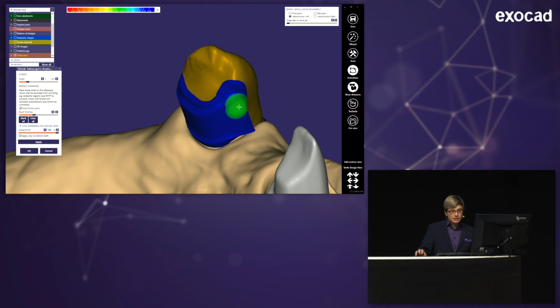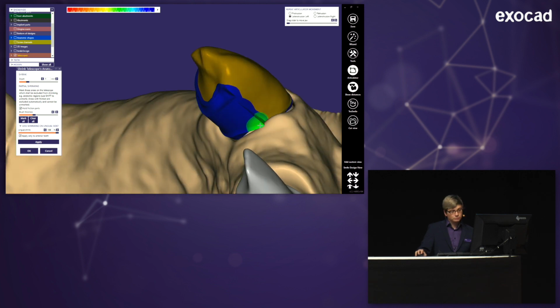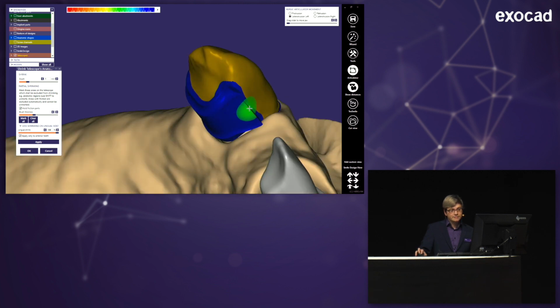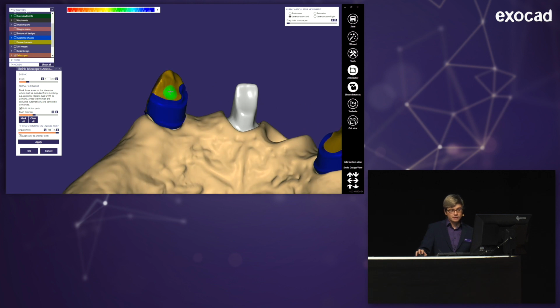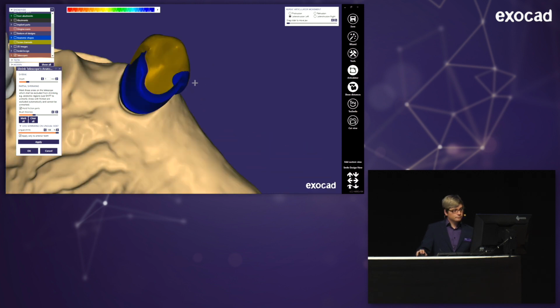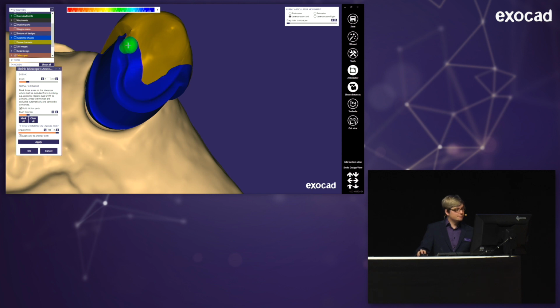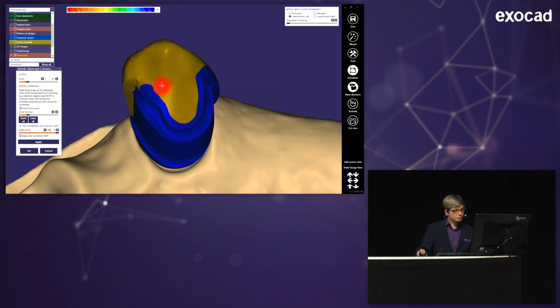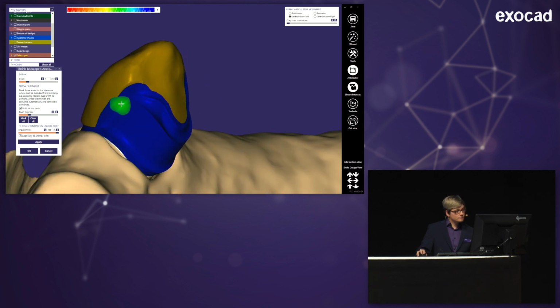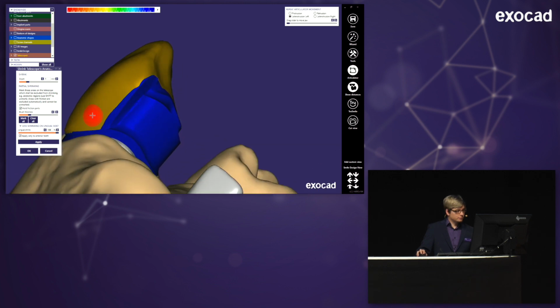How much of that you want to color may actually be based on your milling machine. Doing it just like that for a small gap, so then at the end there will be metal, and the veneering will start here at a yellow color. So I'm doing the same here. As many of you might be aware, if you press the Shift button and scroll the mouse wheel, the size of the brush actually changes, which is really useful in those cases. So for now, this is OK.